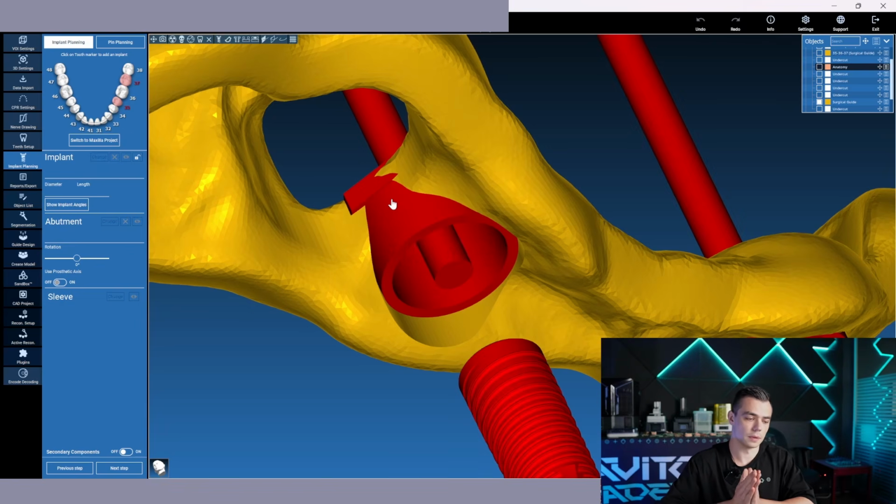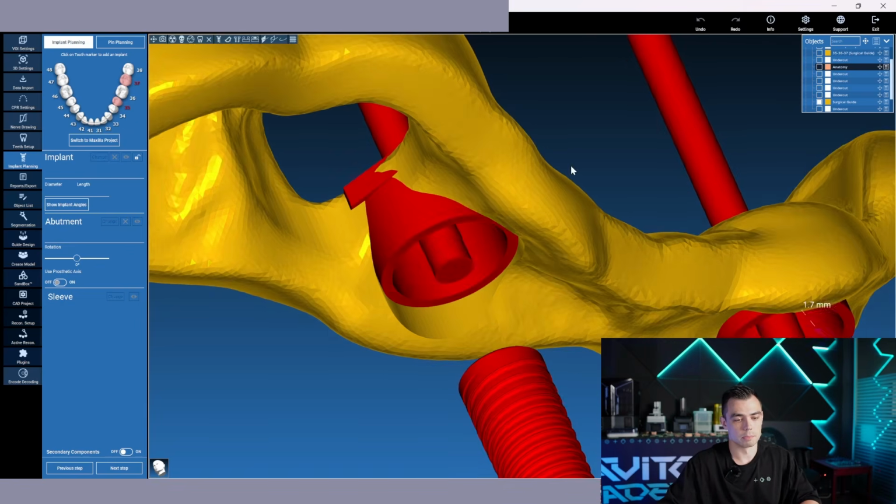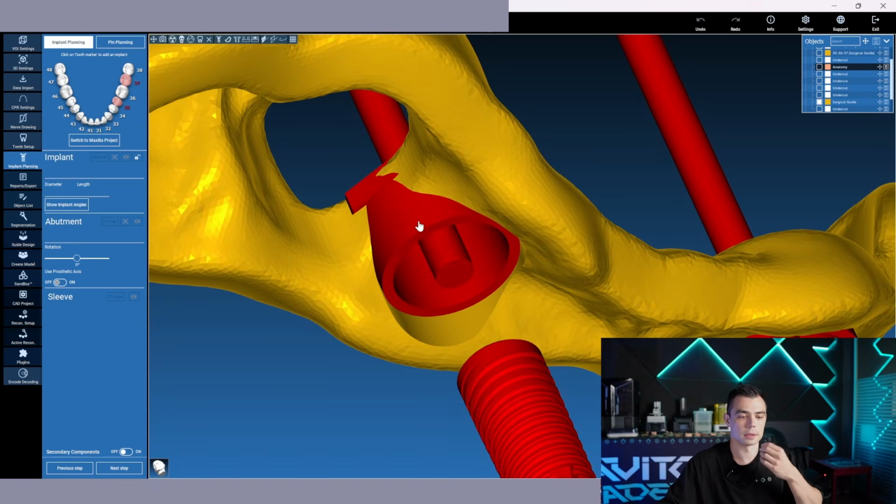They are installed with the same resin as the surgical guide, and there is no chemical adhesion between the surgical guide resin and the metal sleeve.